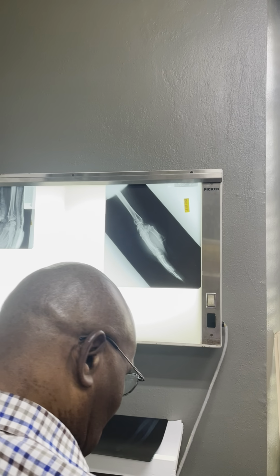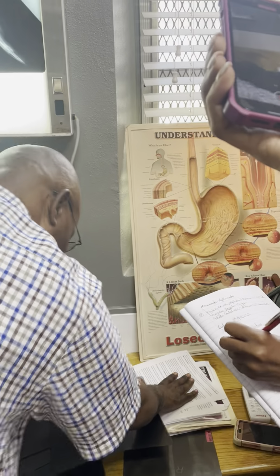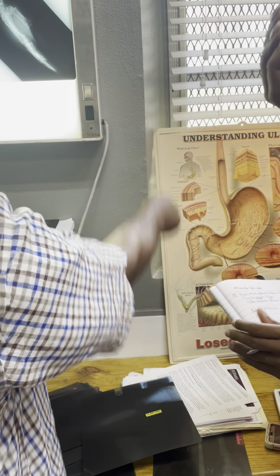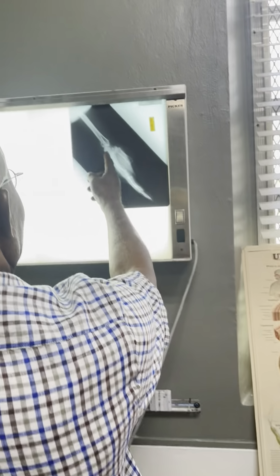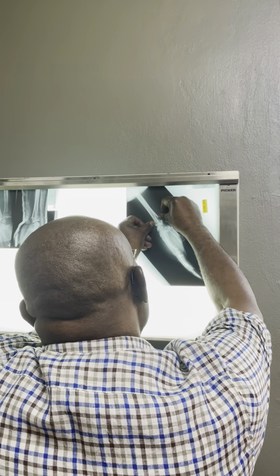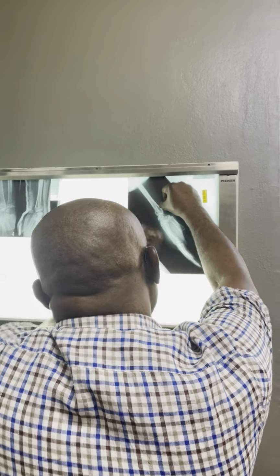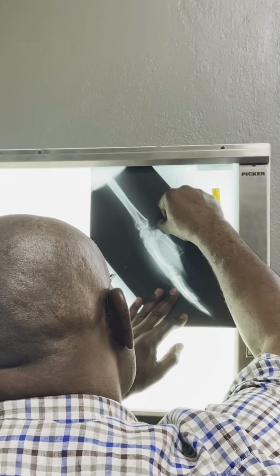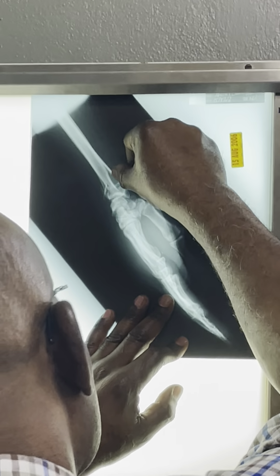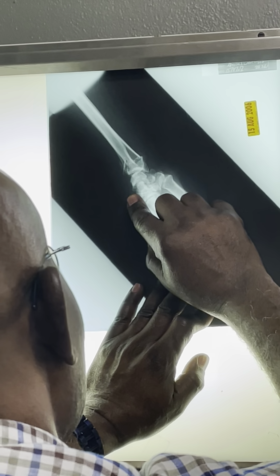So where do you think your hand is going to go? Look and see where you fall on your hand. Your hand is going to go backwards, right? Look at it. Has it gone backward? Yes, look and see. Remember, here is the fracture, and the proximal bit is the intact part. Look and see where your hand should be. You see it's going backwards? That's where it should be, but look at how it's tilted, or if you want to say angulated, there. Agree?